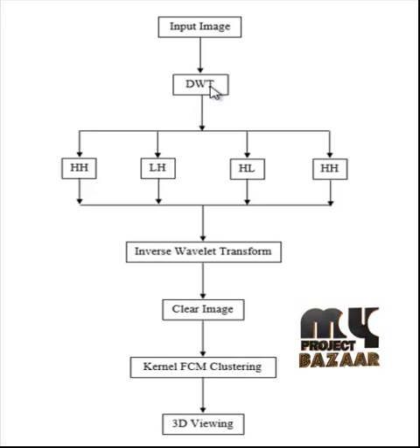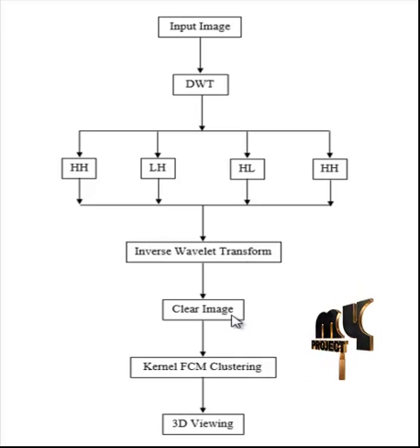After that, inverse wavelet transformation is applied. As a result, the image with clearer regions compared to the input image is obtained.